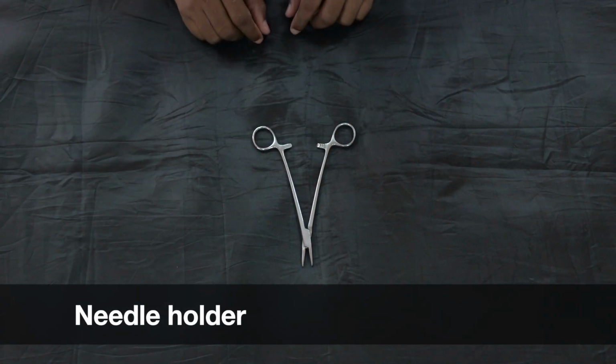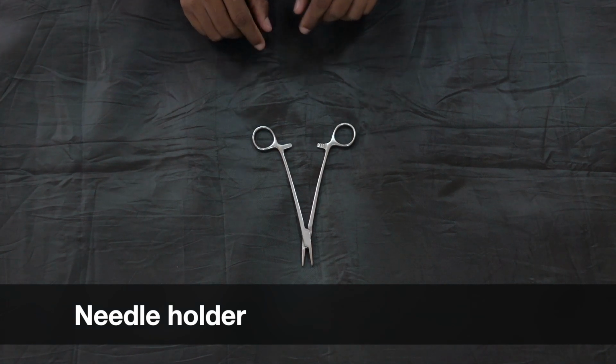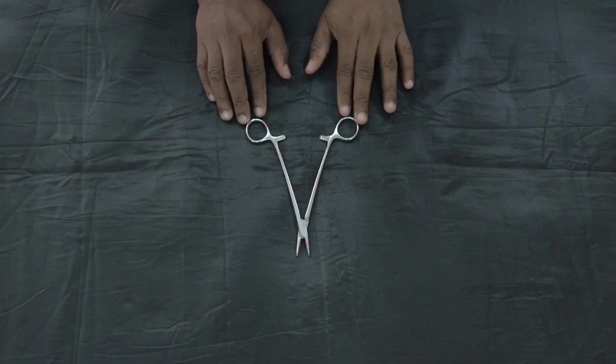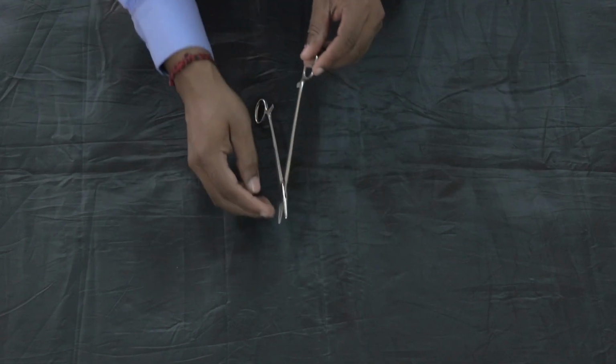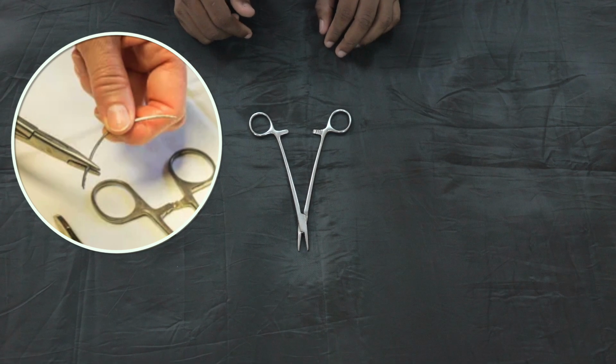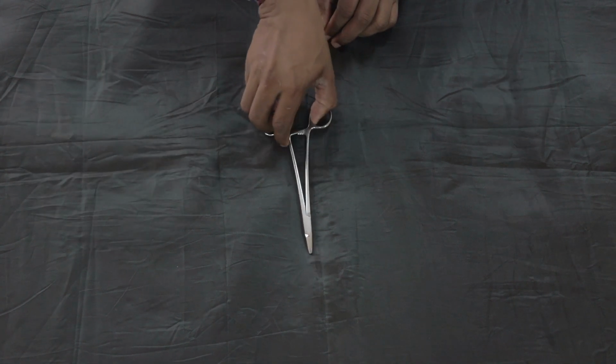This is a needle holder commonly used in surgery, which has a handle with a lock, a straight shaft, and the jaw. The jaw is specially designed with some ribs to hold the needle during the suturing.